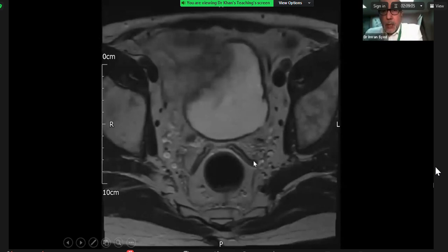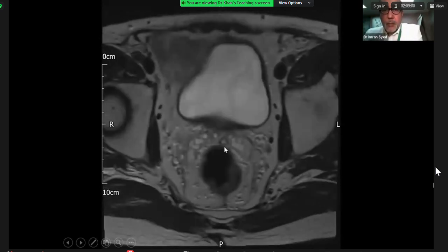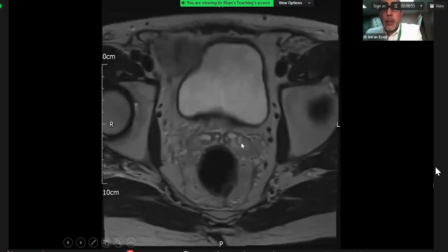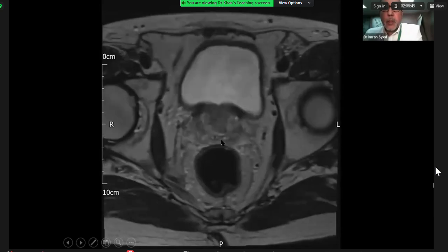And you can see that in most men, the vas deferens comes in medially, and you can see that it joins the genu of the seminal vesicles on either side. So the seminal vesicles, bulky, coming in, and they immediately join. So that's, let's go back. That's the tip of the seminal vesicles, and these are the tips of the vas deferens. So they're joining.